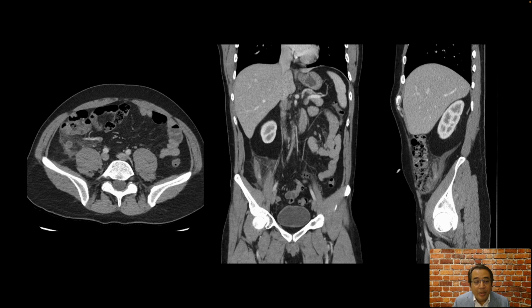Our next patient presented with right lower quadrant abdominal pain, and we performed a CT of the abdomen and pelvis with contrast. This patient's CT shows a tubular blind-ended structure in the right lower quadrant with some proximal focal hyperdensity and surrounding inflammatory changes. So this is a classic example of acute appendicitis, also seen here on the sagittal image, and also on this transaxial image we see a very enlarged, distended and dilated appendix with a lot of periappendiceal inflammatory findings.